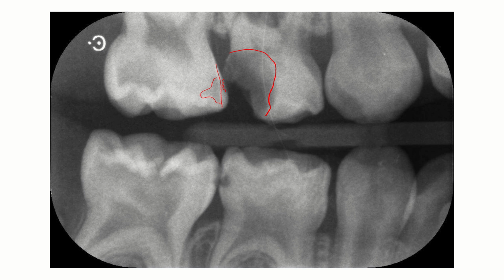The other one that a lot of people found no problem was the lesion in this tooth here. Again, a lot of people described this as ICDAS 2. Now your ADJ is running about there, and we can see that the lesion progresses into the dentine. Therefore, that's also an RA3. There is a very small lesion here, which actually the majority of you found, and I would describe that as 1 or 2, which was accurately done.